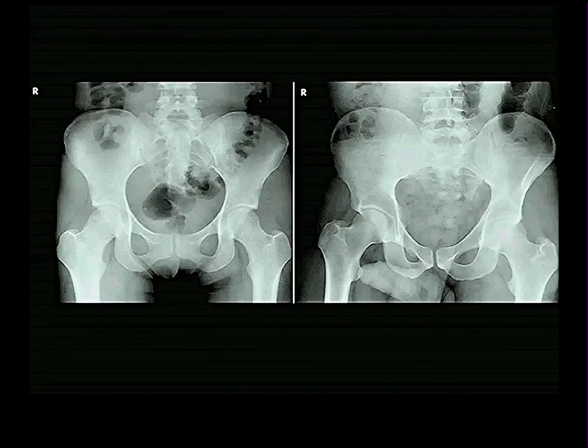There are not nearly as many things in the pelvis as in the abdomen. So that will make it a lot easier for you. It means I'll show more slides of just pathologies and anomalies, because it won't take us very long to go through the actual structures.